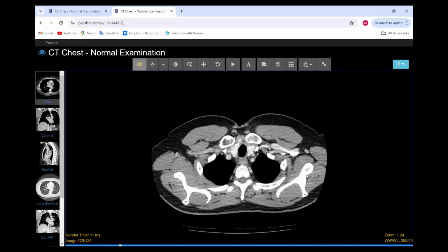It appears with homogeneous enhancement, symmetrical in size, and doesn't have any black dots called nodules. If we see this, we put it in the report and ask to do an ultrasound for further evaluation to make sure there's nothing serious.